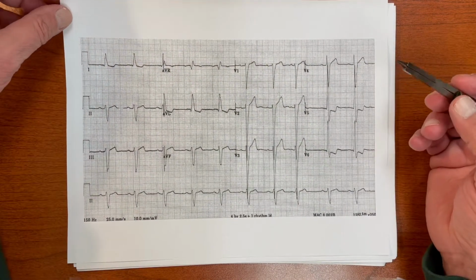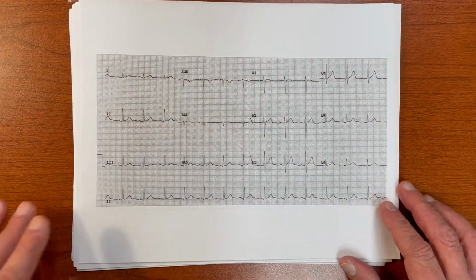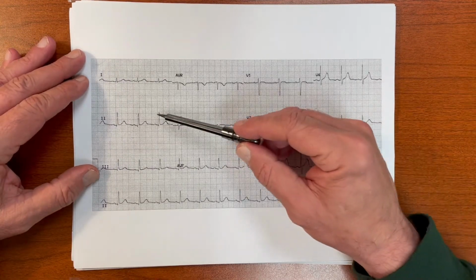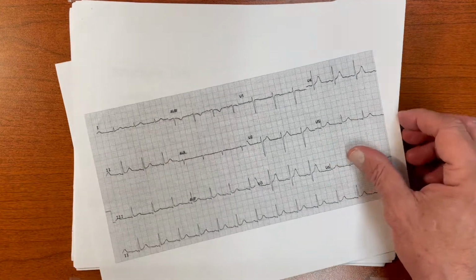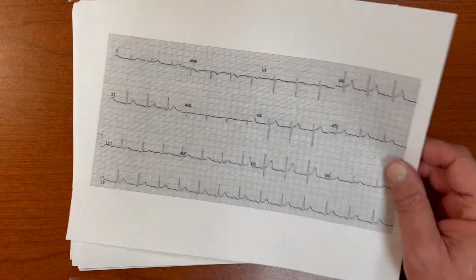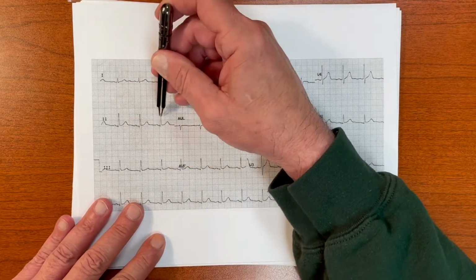Again, that's voltage criteria. Now, let's just discuss something in general here. Let's look at this EKG. Let's, by comparison, start to train our eyes, okay? When we look at this EKG, we see everything looks nice and neat and discrete, right? Voltages look really reasonable. Versus this, the first thing you notice when you see this is what? You see tons of voltage, and you also notice what else? This to the eye appears narrow. The QRS appears quite narrow. You can double check it, and it is.